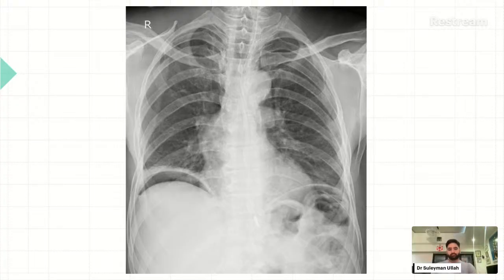So it's likely this patient might have had an uncomplicated appendicitis initially, but the disease progress has worsened, and it's resulted in a perforation, which is not an uncommon thing to see with appendicitis. The common complications of appendicitis are perforation, abscess, and necrosis of the surrounding area. So this would suggest a perforation of the appendix.